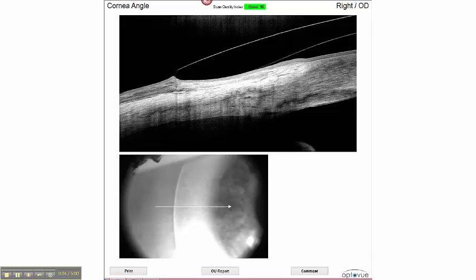I wanted to discuss scleral lens design using Wave, and in particular I want to focus on creating the perfect and consistent edge every time. This is the edge that I've been creating using Wave, nice parallel to the conjunctiva, clearing the limbus and the stem cells. And the key is not clearing too much and or too little.